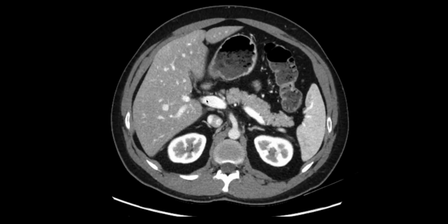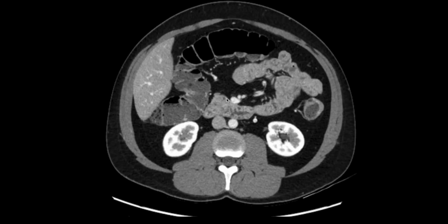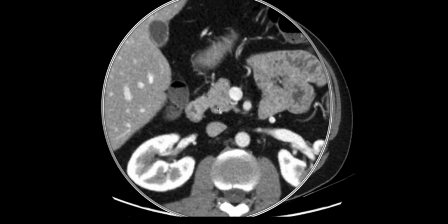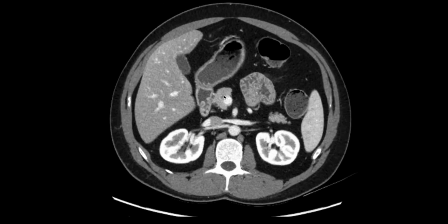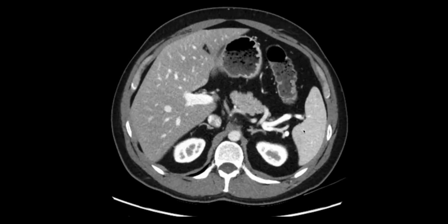After you evaluate the liver, it's time to move on to the pancreas. The key pancreatic anatomy is the lowermost portion, which is called the uncinate process, the pancreas head, where you often see a little dot of the common bile duct, the pancreas neck as it crosses over the superior mesenteric vein, body, and tail heading towards the spleen.